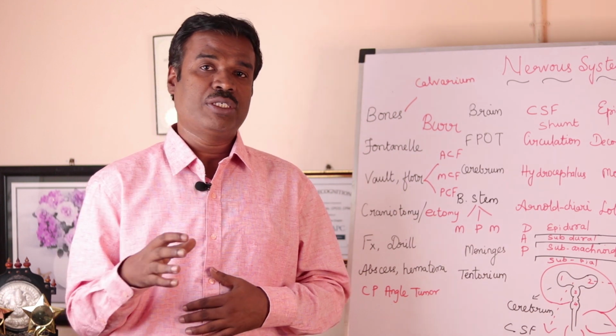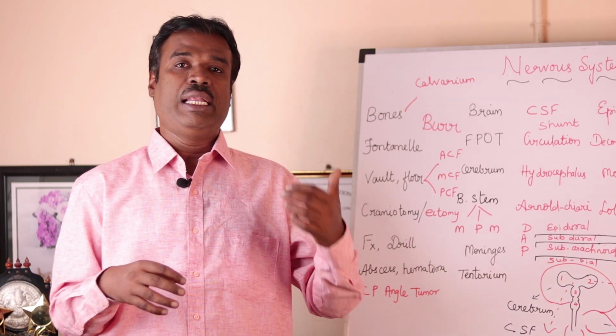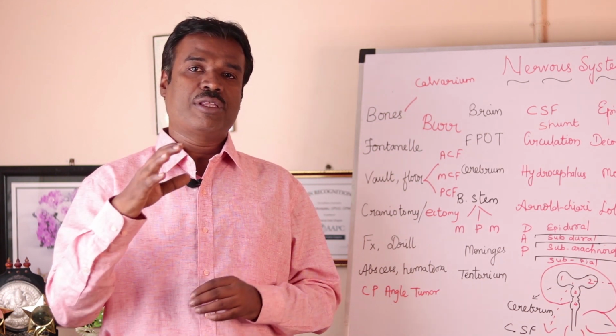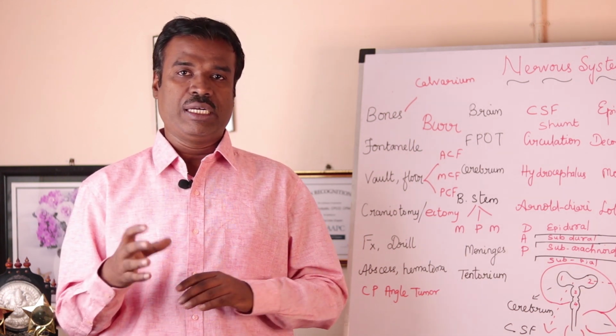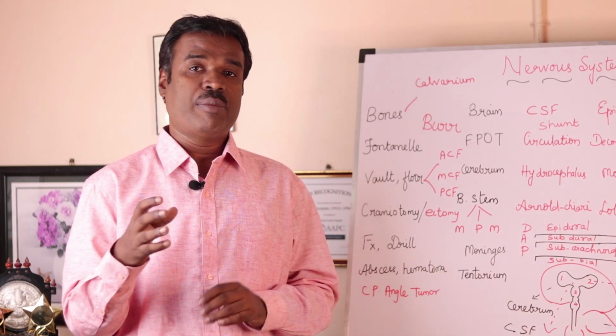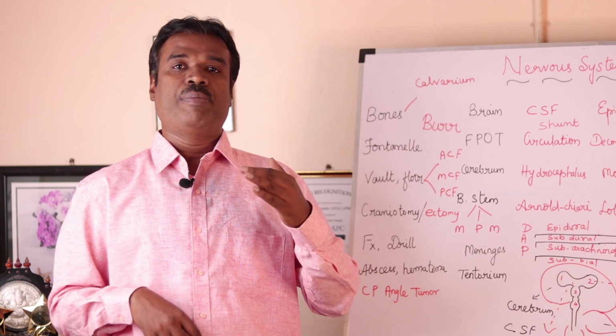Sometimes, in order to measure the CSF pressure, electrodes are also placed within the lateral ventricles, because when an excessive amount of CSF is being secreted, shunting can be done. And these shunts can also be programmable shunts. What do you mean by a programmable shunt?